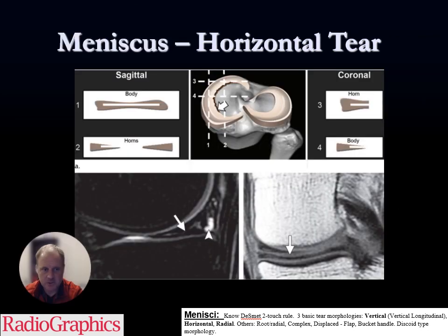Now, once we actually correlate it to MRIs, it looks like this. This was a nice article from Radiographics, where you could get a feel for what meniscus tears look like. So basically there are sagittal and coronal representations of where the tears are, and then it shows you on the picture where the tear is. So on this patient, there's a medial meniscus tear which involves the body to anterior horn mostly, maybe a little bit towards the body posterior horn junction. And they show you some cut lines through.